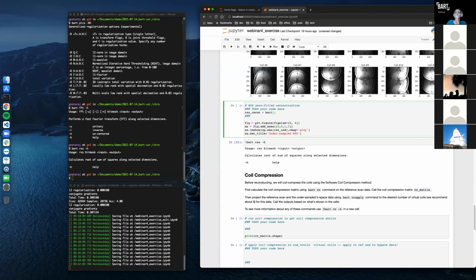So now the idea is, so last time we got that n/2 ghosting because we were taking the IFFT of the sample ignoring the blanked out line. So is the idea now we're just going to zero fill those and then do the IFFT again?